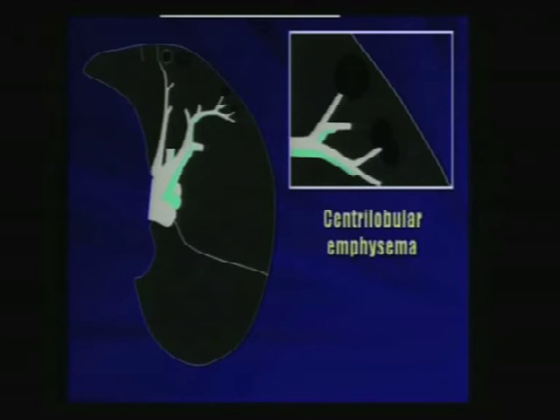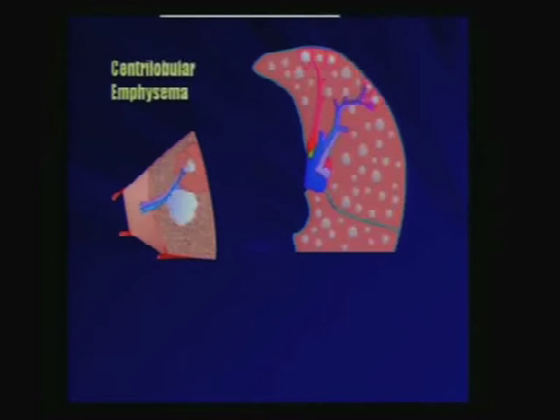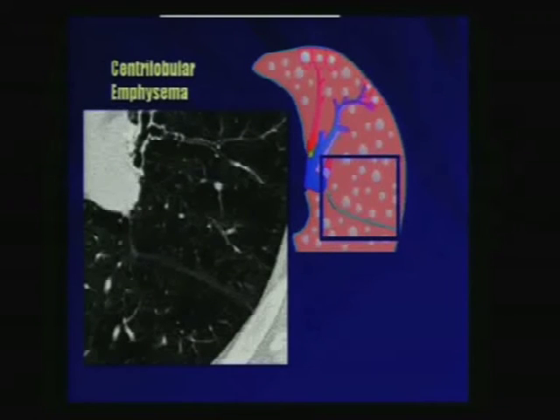So here we're talking about areas of punch-out, areas of decreased opacity because there is no lung parenchyma, and it does follow a particular pattern with the secondary pulmonary lobule. And here's a good example. So we're talking about those areas for which there is a decreased attenuation of the lung parenchyma. And you see here's a nice example of a secondary pulmonary lobule for which you did preserve the anatomy of the vein and the arterioles, but again, you have decreased opacity in comparison to the areas where there is almost normal lung.